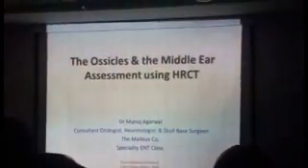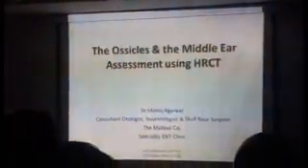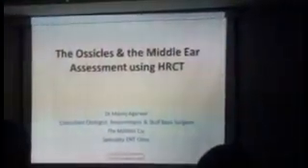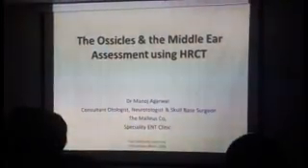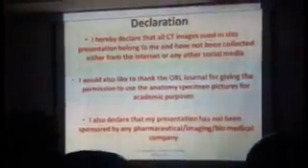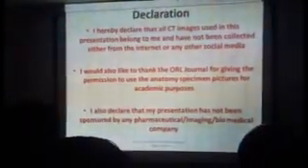Ossicles and the middle ear, both preoperatively and in some other situations as well, because it's a pretty vast topic, imaging of the temporal bone. The presentations that you will see in this presentation belong to me. None of them have been downloaded from the internet or any form of social media.